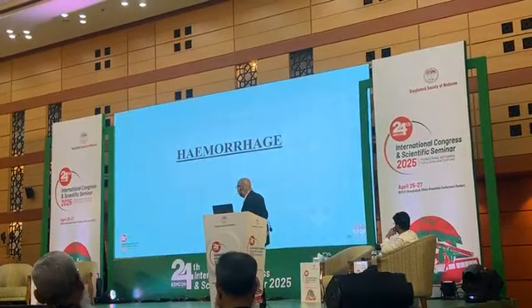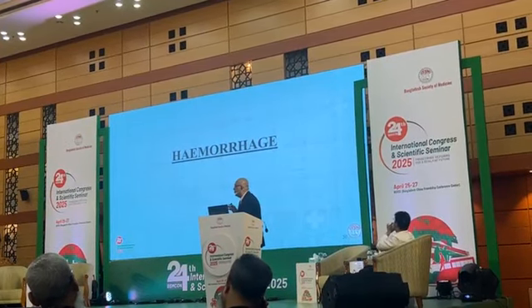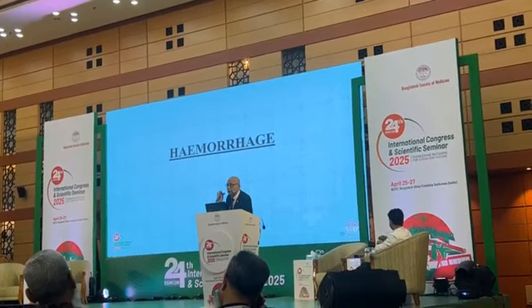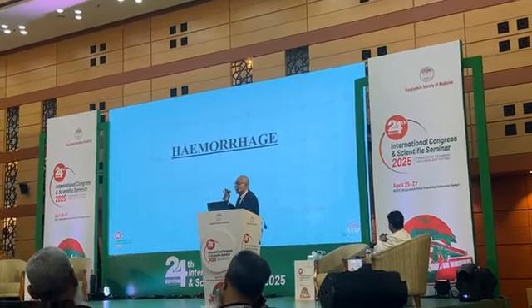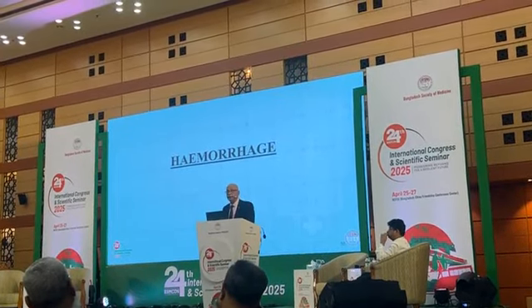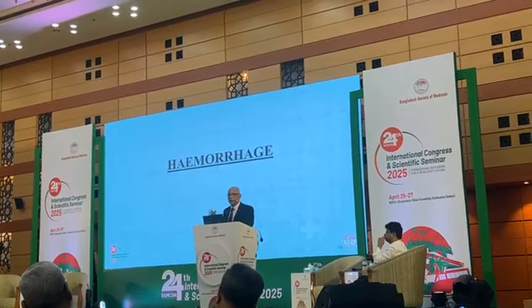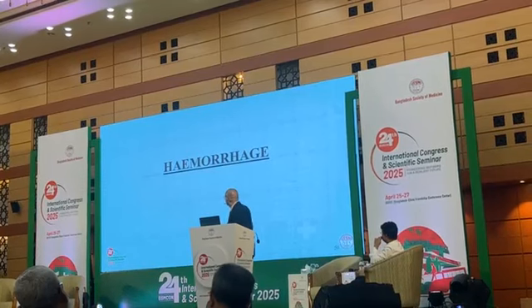Right. So hemorrhages in the MRI, not very ideal to see in acute stage. CT scan is the investigation of choice. But MRI can detect old hemorrhage for the rest of the life very nicely. So after 2 weeks of suspected hemorrhage, we should do MRI, not CT scan.